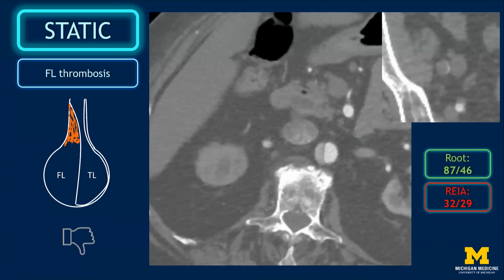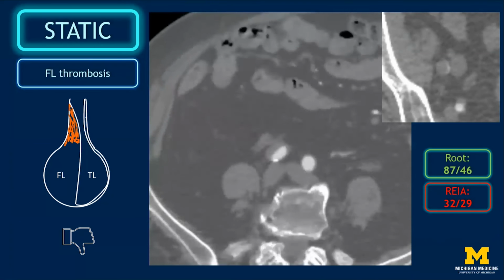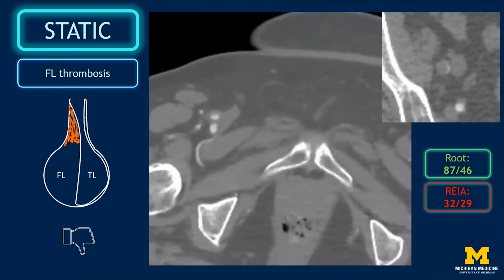When there's false lumen thrombus, sometimes this narrows the adjacent true lumen in the branch vessel and compromises antegrade flow. And this is the case in this example. The false lumen in the right iliac arteries does not have a reentry tear, the false lumen thrombosed, and the thrombosed false lumen then compromised the adjacent true lumen. When we measure pressures here, there is severe malperfusion of the right leg, which manifested clinically as absent pedal pulses and mottled lower leg.